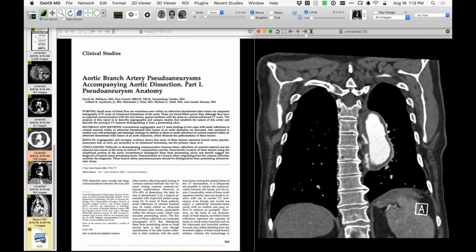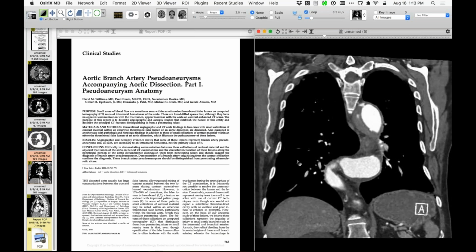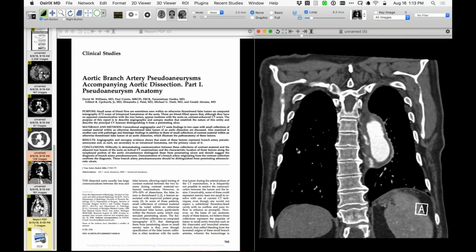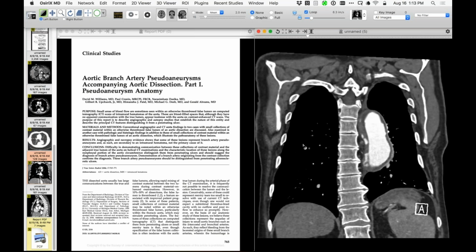And if you have a 3D or a MIP, that's been called the Chinese ring sword sign, if people are into signs. Yeah, if you have a bunch of round things all coming up and down the side of the aorta. Chinese what? Chinese ring sword sign. I think on a Chinese ring sword, on one side of the sword, there are all these round kind of structures that make little circles, rings.